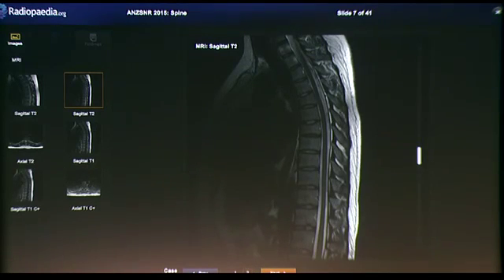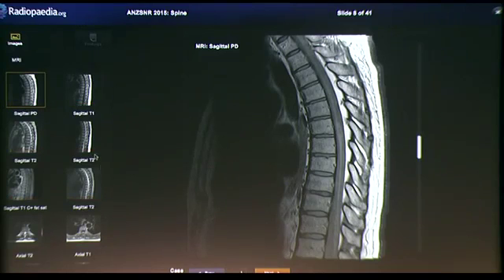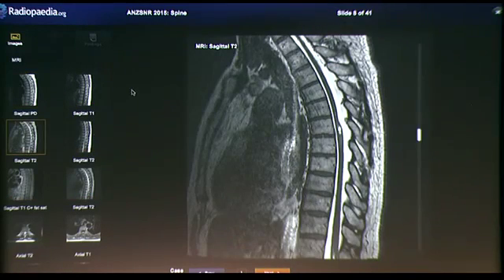So I'm going to contrast that with a couple of different cases. So again, we have an abnormal contour to the cord. There is this spot here where the posterior CSF space is enlarged. The cord itself looks quite abnormal as well, in the sense that there's this cystic focus in the cord, as well as that focally thinned or compressed area immediately superior to it.